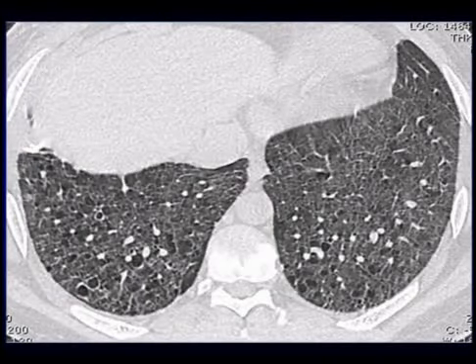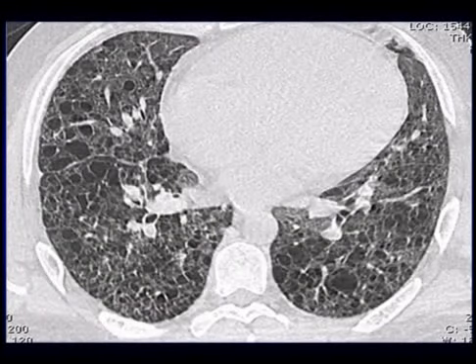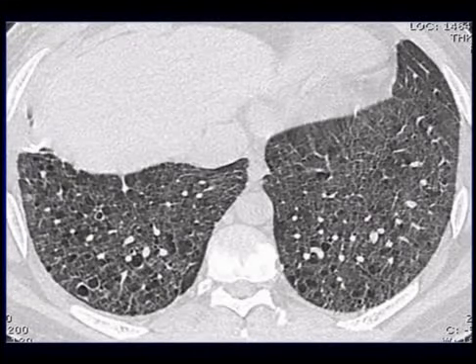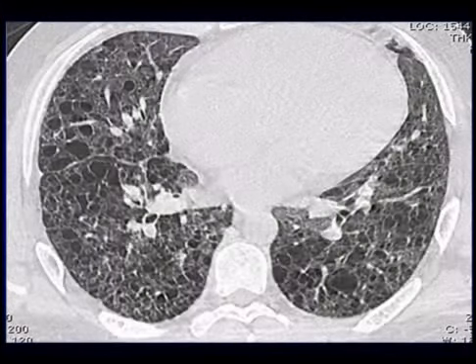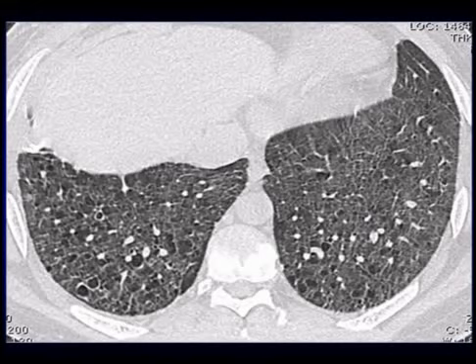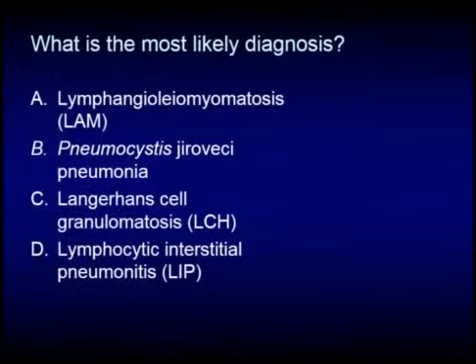So really, if you think about those two as being the primary processes in a differential here, you can clearly see that the unaffected lung here, I mean, this is a very advanced case. This patient actually ended up going for heart-lung transplantation because he actually had group 5 pulmonary hypertension from the Langerhans. But nonetheless, the intervening lung was very abnormal here. There was really no normal lung.